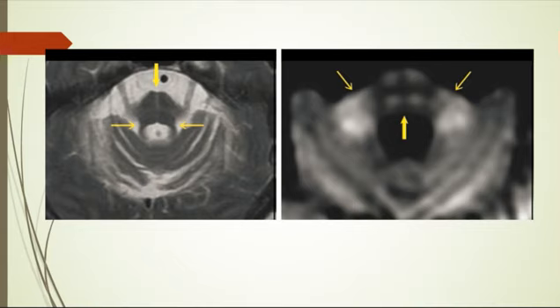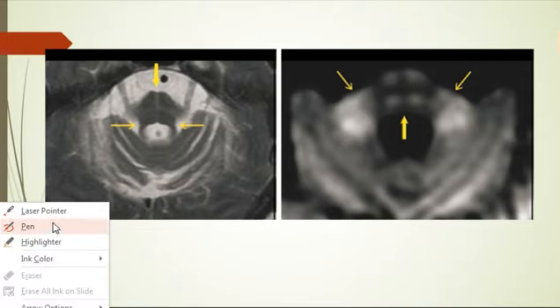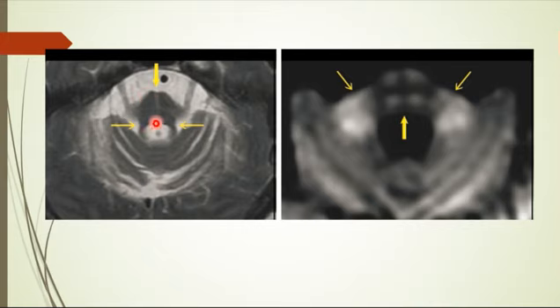However, what else? What are other names we might see here? Do you see this one? This thing here? Just a second. What's this? Exactly. Hot cross bun.